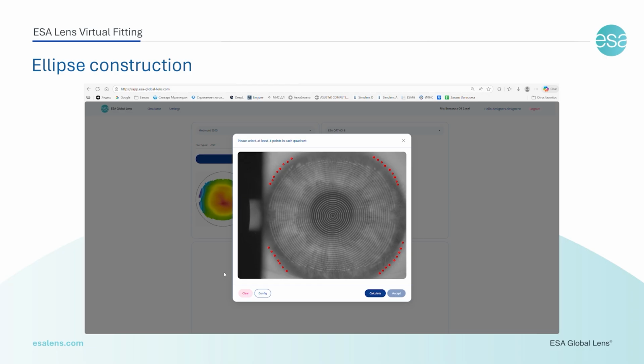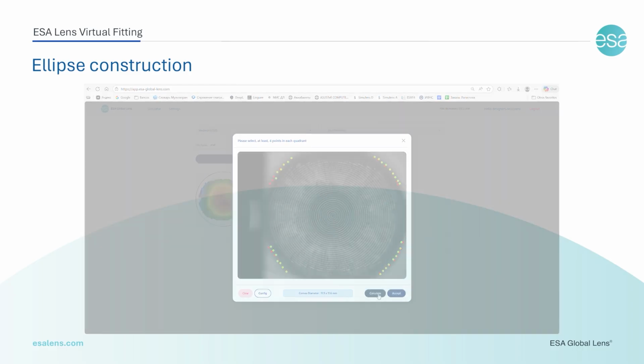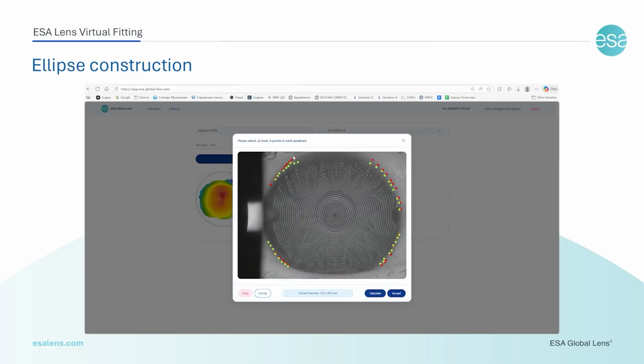After placing your manual coordinates, press the Calculate button. The program will then generate its own optimized points based on your selections. These will appear as green points, which the software will use for the subsequent calculations. You may find that some of the points generated are clearly misplaced. If there is a significant discrepancy, click the Clear button and repeat the process of placing red points, correcting the locations where the initial measurement was inaccurate. If the discrepancy is minimal, it may be neglected.